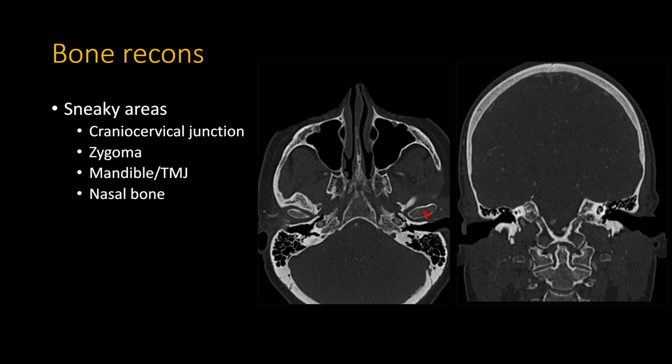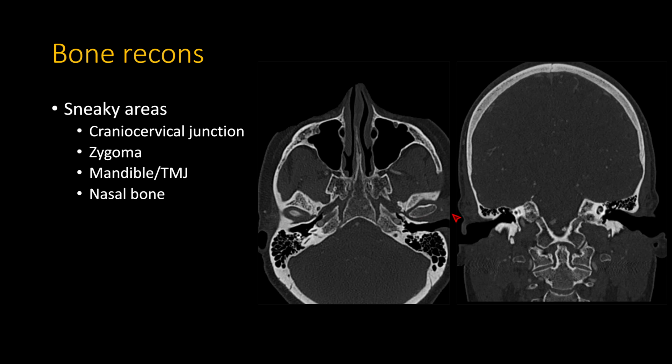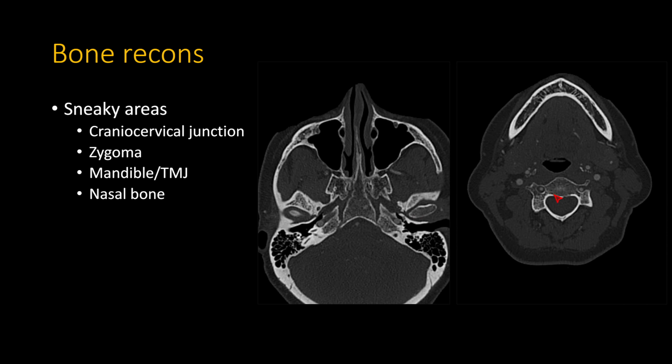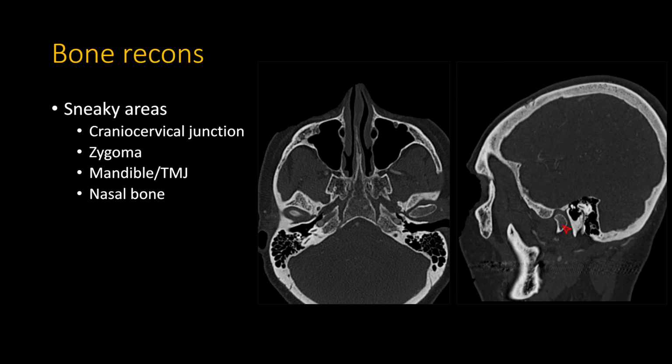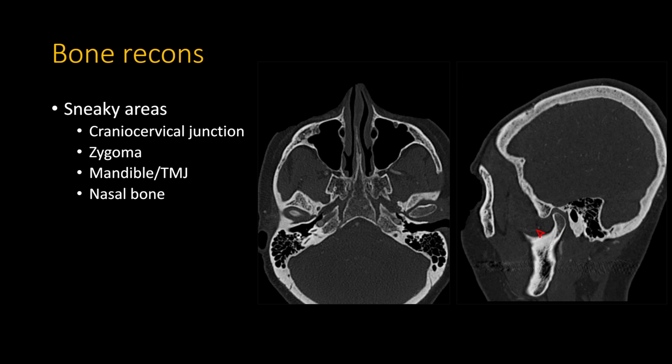And so you want to make sure that this mandibular condyle is located in the glenoid fossa. It also shows up pretty nicely on the sagittal, so I always look on the sagittals for the mandible to make sure it's located and I'm not dealing with some kind of an unsuspected fracture. I've caught a couple of unsuspected fractures. They typically tend to be people who are drunk, and so they don't hurt quite as much to say, oh, my jaw, somebody hit me in my jaw and I hurt or something like that.